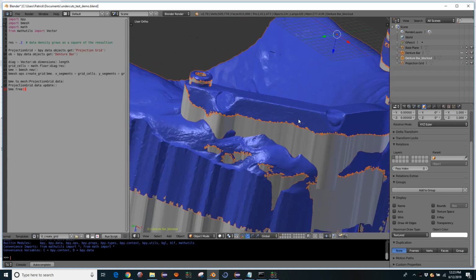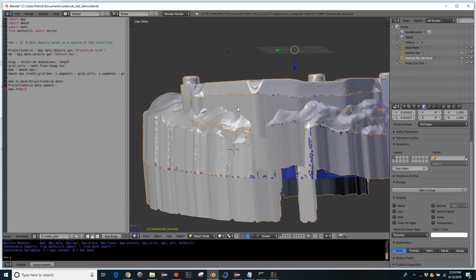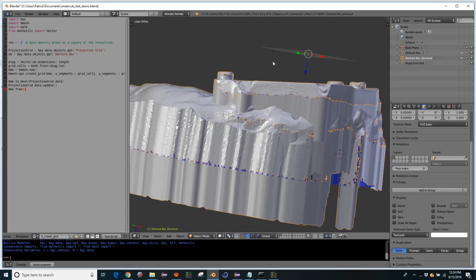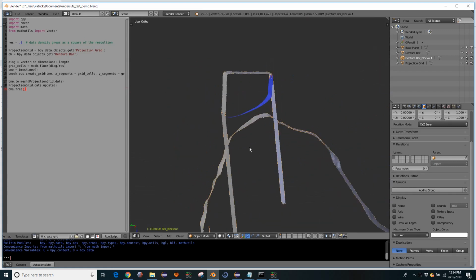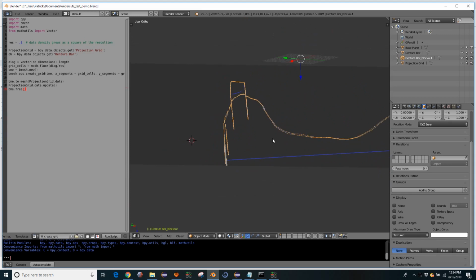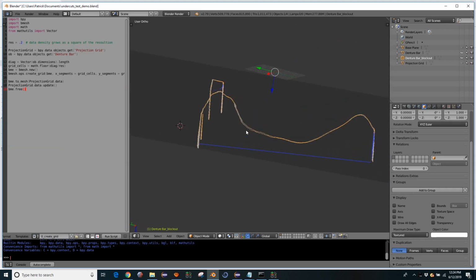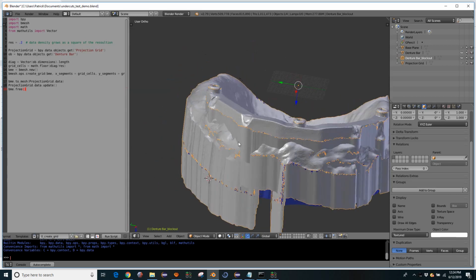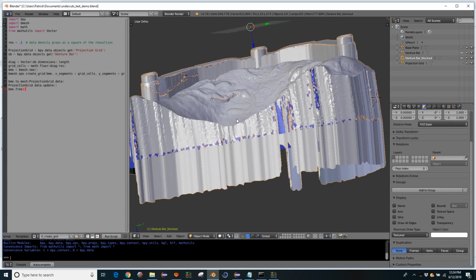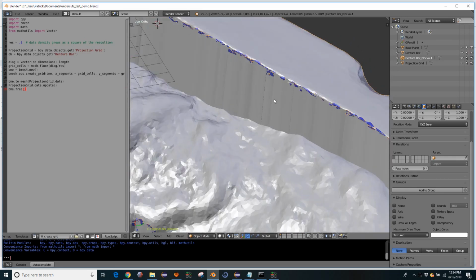because the undercuts are very precisely blocked out, and the error at the rest of the model is 0 because it preserves the actual original data. Problem is, it just drops these faces down, so it doesn't really know exactly what to do after that. So to go from here to a closed model is kind of difficult. But I think that this is ultimately the technique that I'm going to revisit for undercuts.